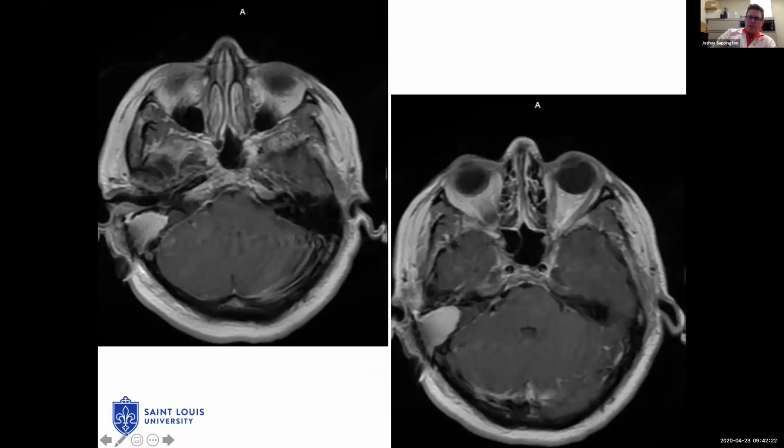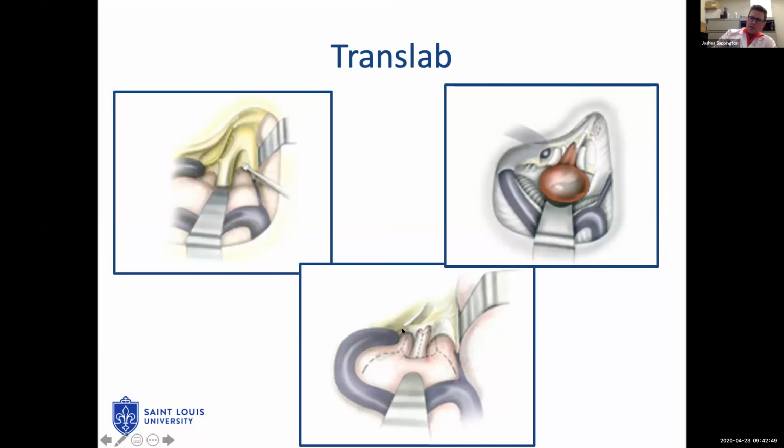And so this is a postoperative view, and I'd just like to bring this up for postoperative management of a patient status post a right side translabyrinthine acoustic neuroma resection. We'll see that there's this ball of very enhancing stuff right here. And this stuff is abdominal fat. The reason why we use an abdominal fat graft is because this posterior fossa and internal auditory canal dura gets opened. And ultimately, we produce CSF every minute, every day.